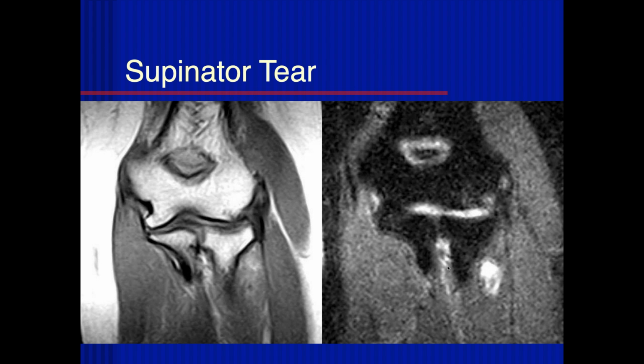Okay, good. And then here's another supinator where we can see the edema. Would you be a little worried about the biceps if you have a supinator tear? Yes, I know I would. I think the two are synergistic with each other, right?